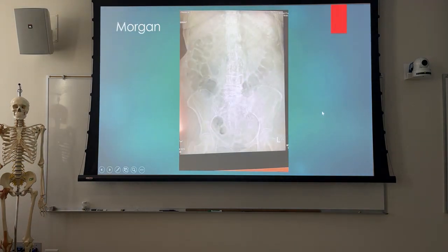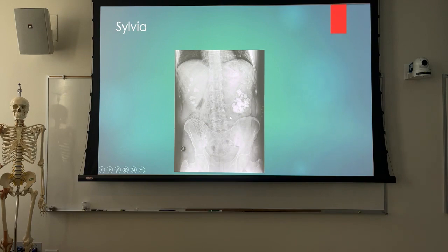So again, just loss of bone mineralization in this patient, just a mess. And Sylvia gave us this one, and there's your kidney stone. Staghorn kidney stones just completely fill up the calyces. And for the treatment of this, they can't do shockwave lithotripsy and break that up.